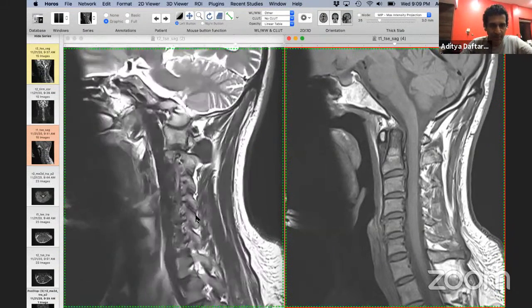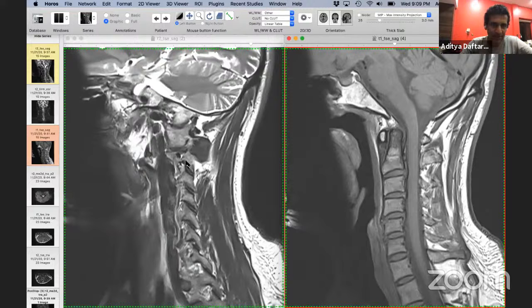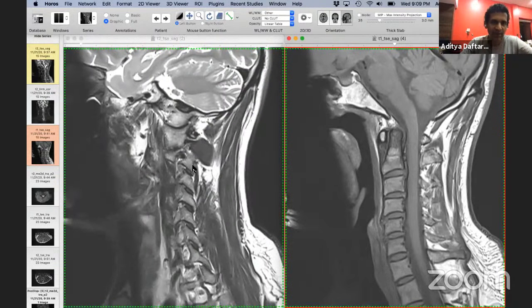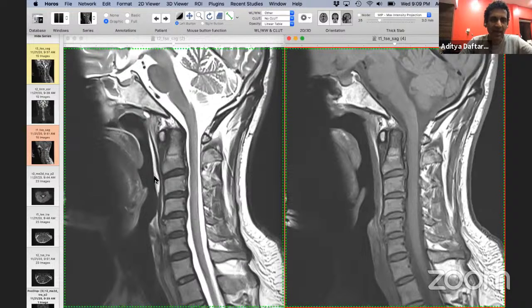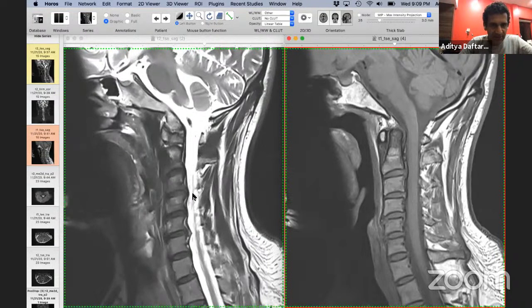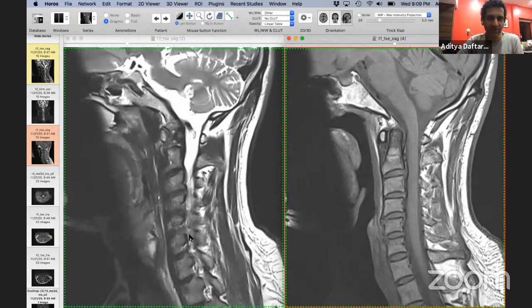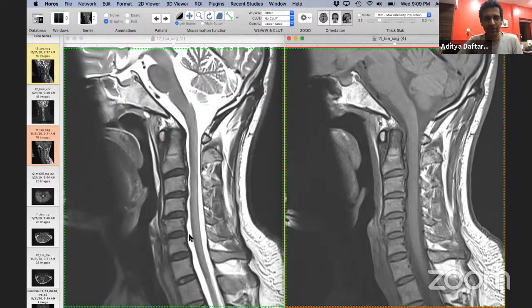This is also a very important series for us to go laterally and to look at the parasagittal images at the facet joints. And this is a great place to look for the facet joints and facet arthropathy. So that's one of the things that I will look at in these cases typically. And then when you get towards the periphery, you can sometimes see uncovertebral spurring and lateral recess or foraminal disc herniation. So remember to look carefully at the parasagittal images for those major things.